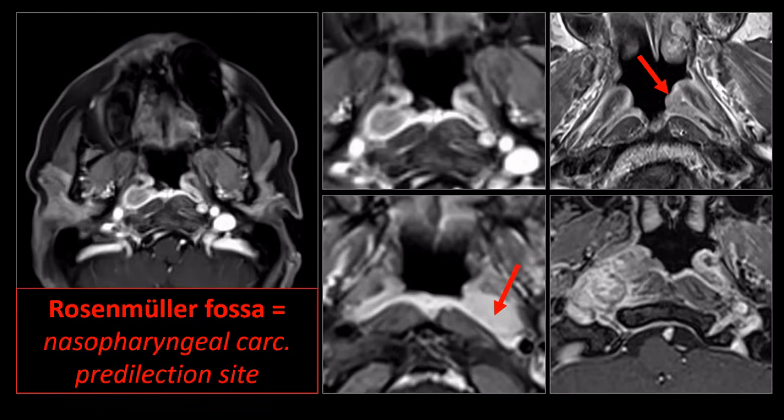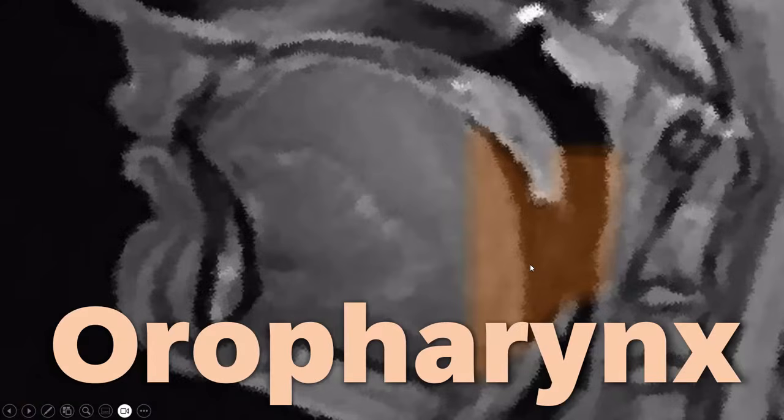And this is a large tumor which has infiltrated the prevertebral space. So we see infiltration of the longus colli muscles over here and also of the parapharyngeal space. So this was a larger nasopharyngeal tumor, but I have a draft on staging of nasopharyngeal cancer, so that will be for a future video. This concludes introduction to imaging anatomy of the nasopharynx. Let's get ready for part 2, imaging anatomy of the oropharynx.